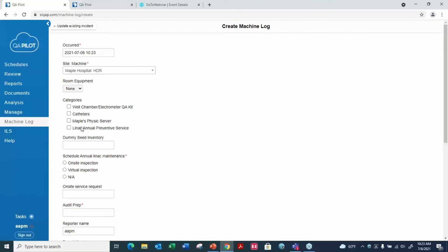So that's how we manage those things. And again, it's a way for you to standardize across the organization, but also customize specific to room types, or specific accessories and equipment being used on a specific LINAC. These are important to be able to have standardization, but also customize.